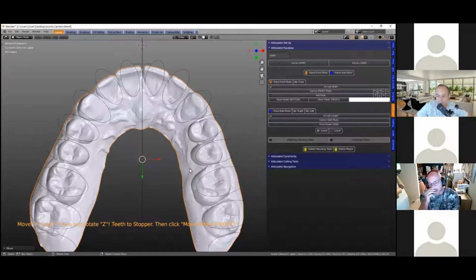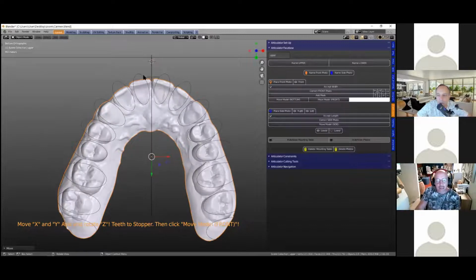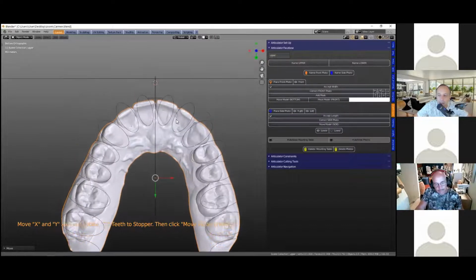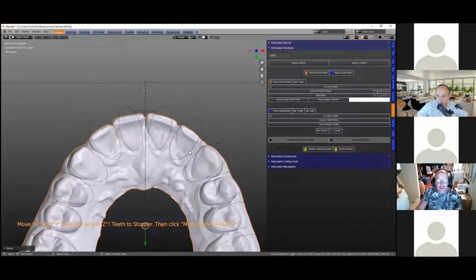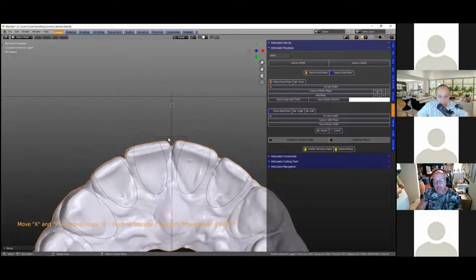Quadrant, it'll appear in the center. If this was a quadrant, you'd place that more or less within the range of these little ovals, for example. So here, you're trying to get it to the stopper in front? Yeah. So this little cube is the stopper. We call that the rectangle.